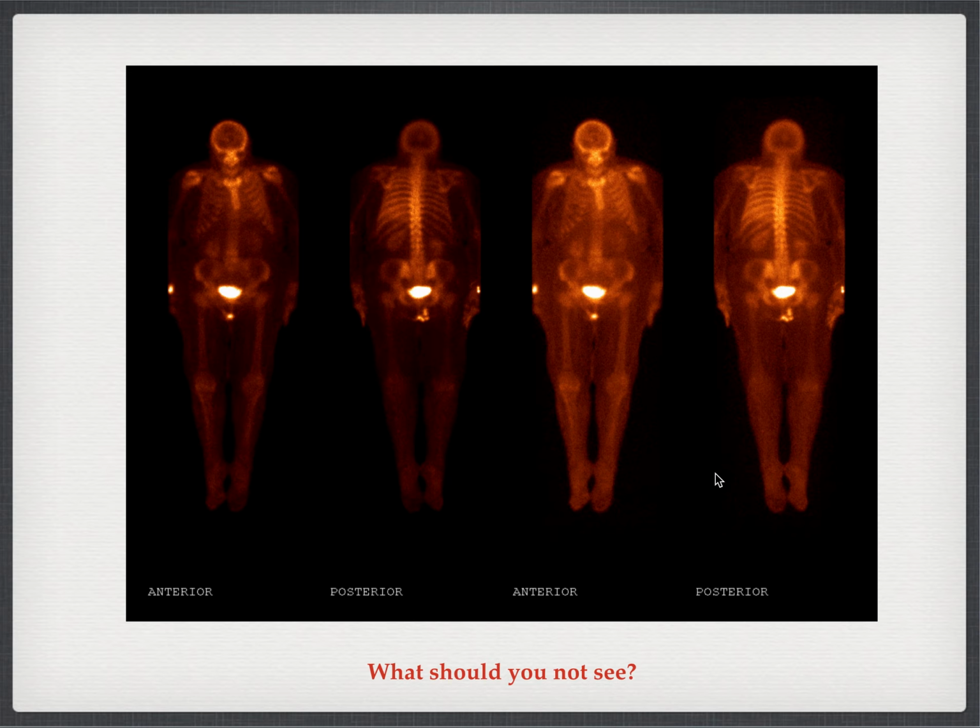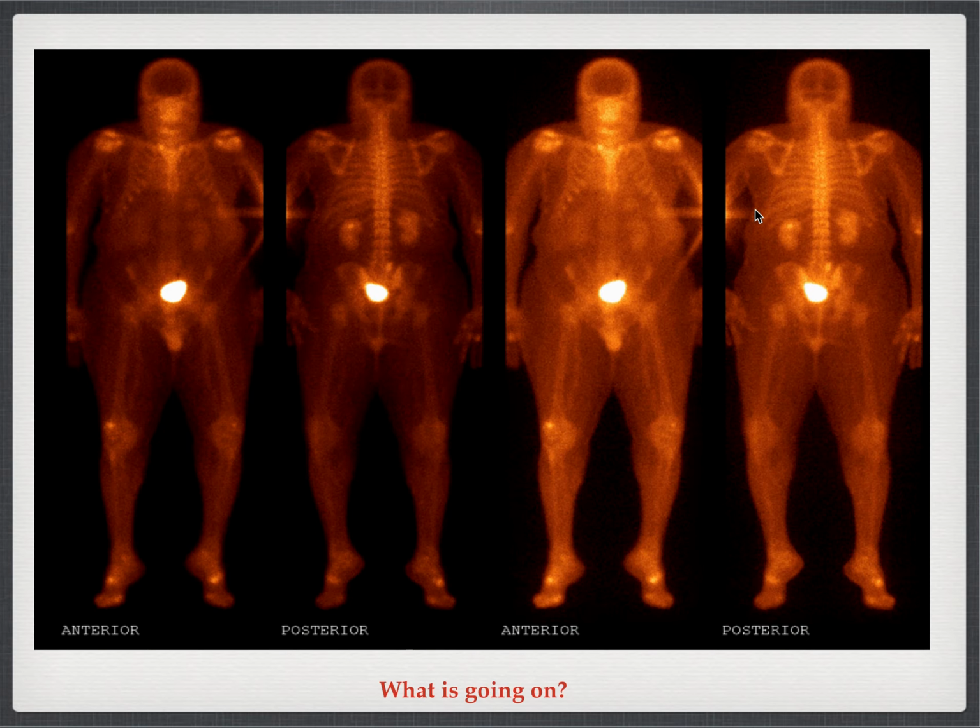What about this case? This is one of the few favorites for nuclear medicine people, using bone scan for looking not at the bones and thinking that this is important, but that's what we like to do. And in this particular case, we see malignant pleural effusion, so we see more uptake in the soft tissues of left hemithorax than we should.